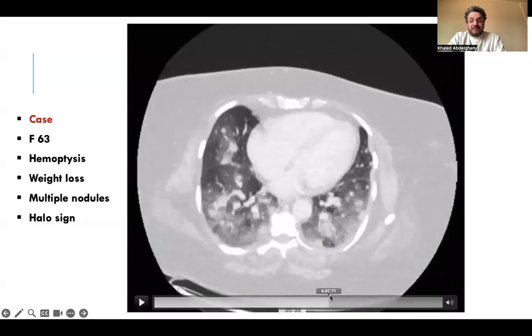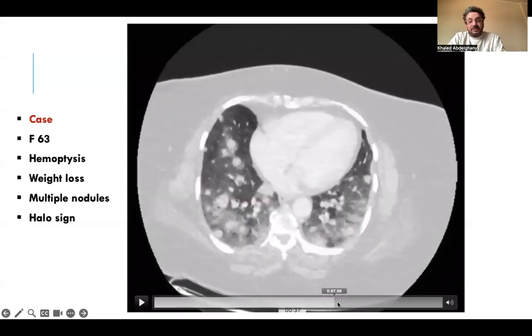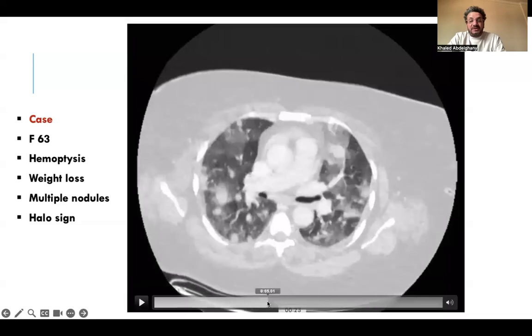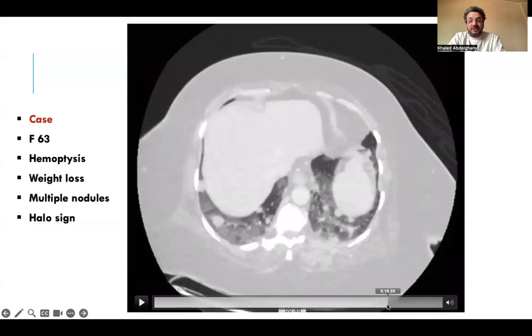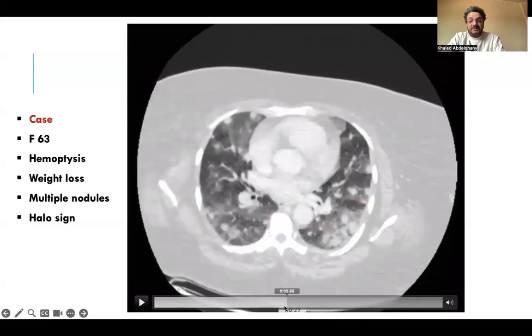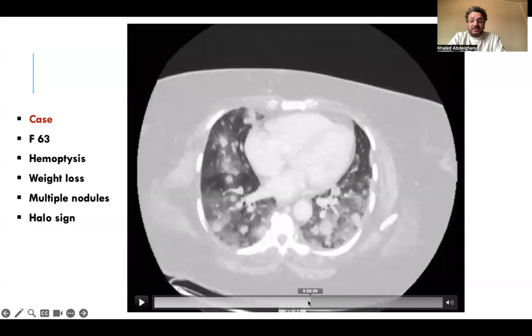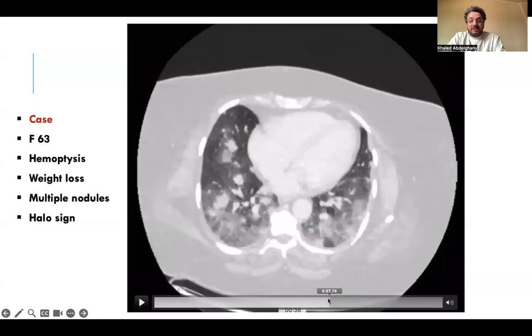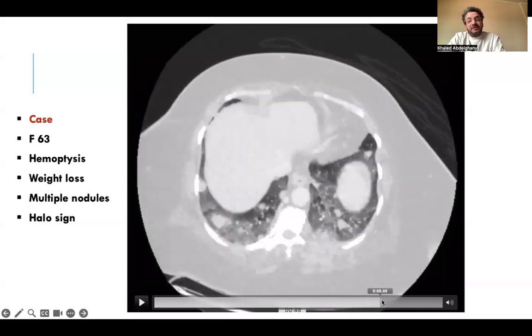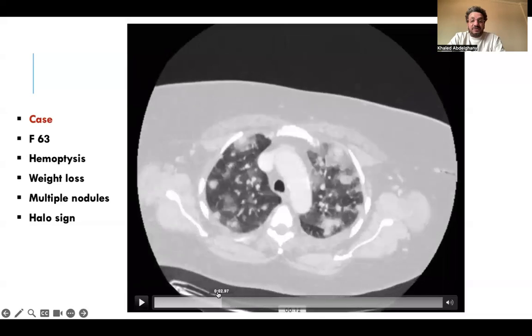The miliary infection nodules will be marginally sharp, well-defined, as well as the metastasis, but presence of halo sign is characteristic for the metastasis, not to miliary infection, either TB or histoplasmosis, plus the large size of the nodules, macronodular pattern here, is usually with the hematogenic spread of malignancy, not with the miliary hematogenic spread of infection, TB or histoplasmosis.